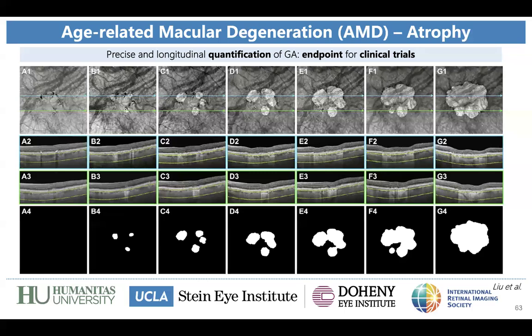Extremely important point, especially for clinical trials. As you all know, of course, the thickness of the choroid is different in different patients. So we should very carefully adopt different slabs in the choroid to visualize hypertransmission defects, because there can also be the influence of the sclera in some cases for the hypertransmission.